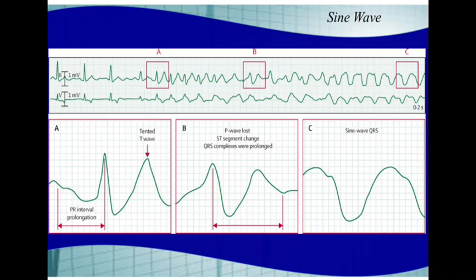You will get peaked T waves when you get potassium levels over 5. So, let's say 5.2 is the threshold. When we say we have potassium levels in the 6s and 8s, that's a pretty high potassium level. When you get over a potassium level of 5.5, you start to have those peaked T waves. And then you'll actually get a widened QRS and loss of P wave, and then eventually the sine wave pattern.